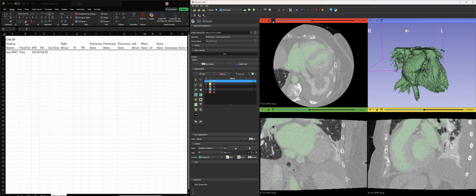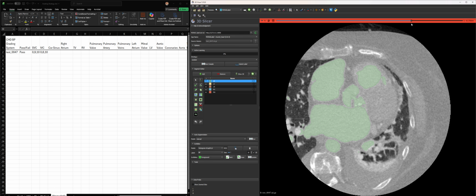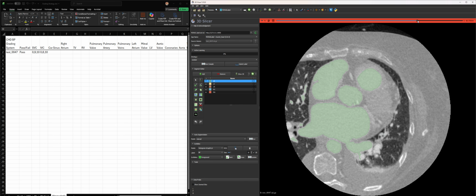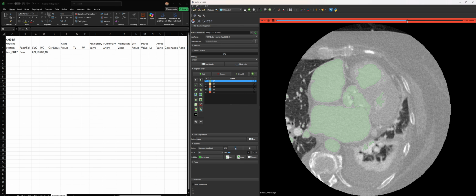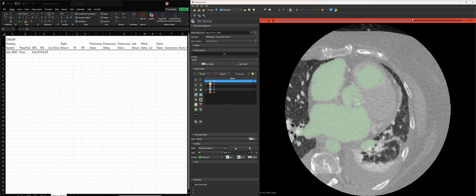So if we go back to the axial, coronary sinus, it's obviously good. I'd say it'd be about a, I mean, it really goes around. But with this dilation, you're getting up into a bunch of other structures. That's probably subjectively where I cut it off. So I would say about right here, because I do have coronary arteries coming across there. You see the coronary there. So this is coronary sinus. So around here, that's still pretty good.